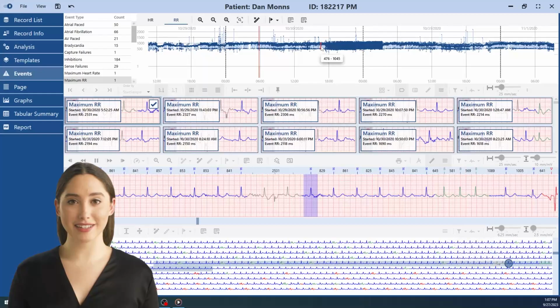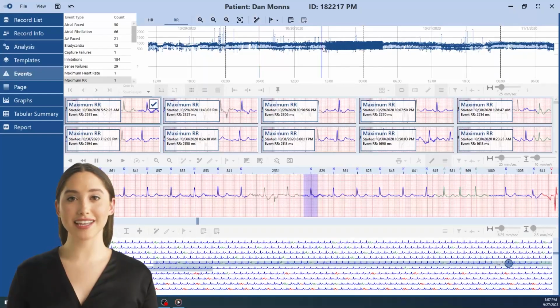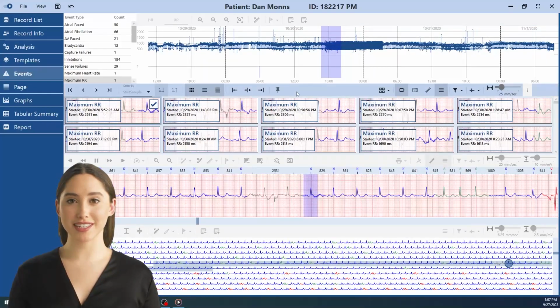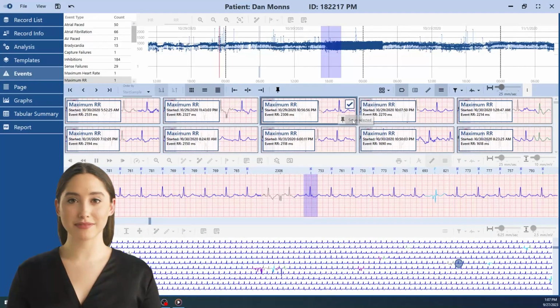Drag to select, and exclude incorrect segments with an event that looks incorrect in the RR trend, ECG strip, or page pane. After you have deleted all incorrect events, right-click the required event in the middle pane and select Set as Selected to include it in the final report.